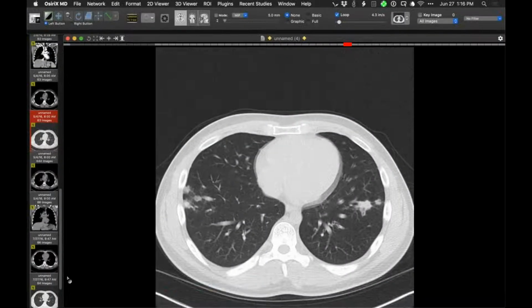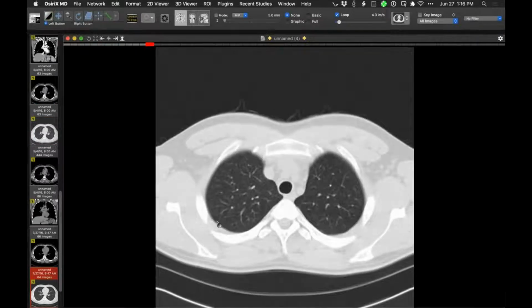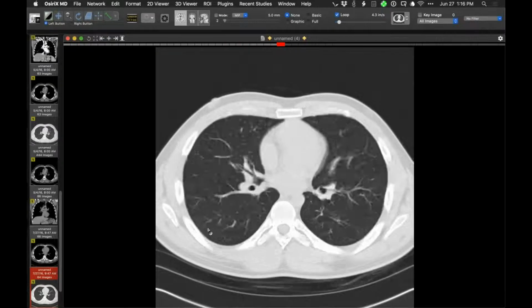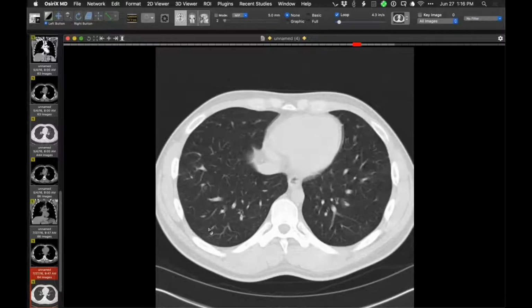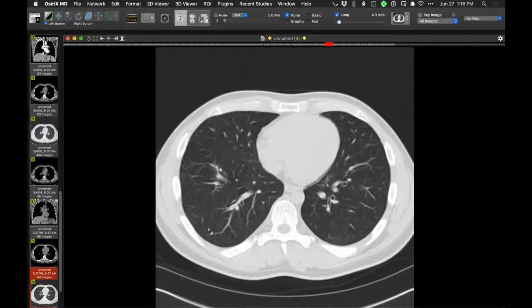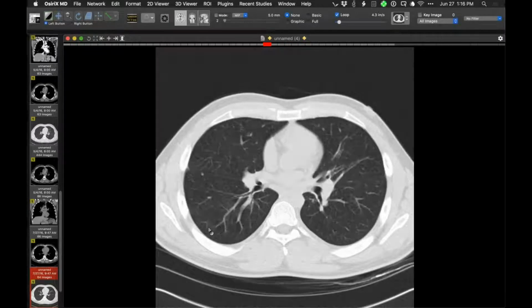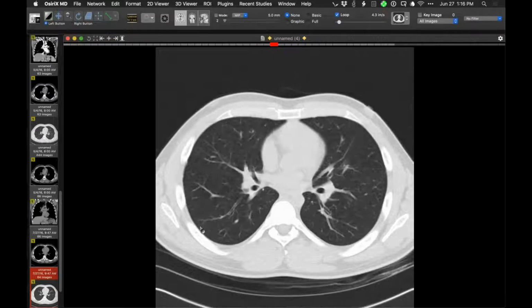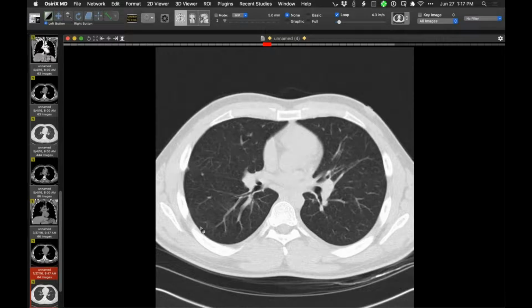That was May. And you'll see these clear up within a short period of time in the absence of any treatment for it. I don't know whether he's on IVIG, but there was no indication that he was treated for an infection. So the phenomenon of waxing and waning of GL-ILD is a known thing. Of course, one doesn't know what really goes away, are the little granulomas, the cellular granulomas, or the foci of, say, lymphocytic interstitial pneumonitis. But I've seen a spontaneous waxing and waning phenomenon in this quite a few times.